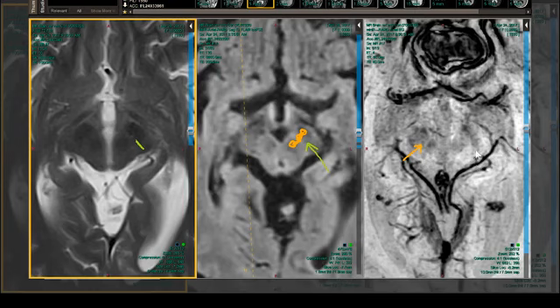Now, we do have a swallowtail sign right here. There's the swallow's tail. There's one tail. There's the other tail. The white thing in the middle is separating the two tails. And I put an arrow on this right here where you're starting to see the red nuclear iron and the substantia nigra iron bleeding together. You're seeing how the iron is medializing from lateral to medial in what's a very typical example of Parkinson's disease.